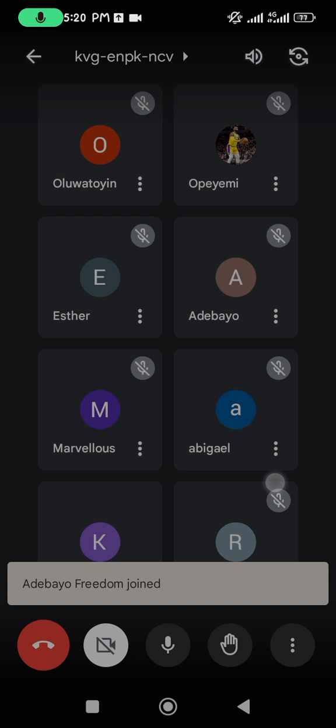And the duration of our PR interval is 0.12 to 0.20 seconds. That is how many? 3 to 5 small boxes. I'm sure you already understand the concept of this duration. I just divided it: 0.12 to 0.20 seconds is 3 to 5 small boxes. So our PR interval is usually from 3 small boxes to 5 small boxes.